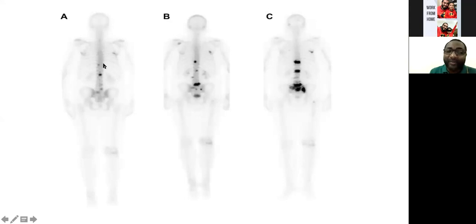And again, the unfortunate thing is that most patients who experience flare phenomenon, apart from the bone scan increasing in intensity, their symptoms also tend to worsen. There is worsening of pain because there is increased blood flow and increased vascularity. So if you look at it, again there is an increase in flow. This is usually not because the patient has progression of disease, but because the patient over time developed a flare phenomenon.